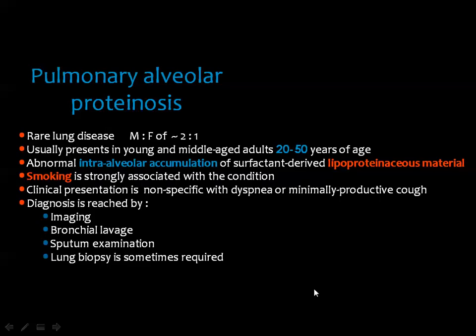Then we come to pulmonary alveolar proteinosis. You remember, we are discussing now the patchy alveolar opacities. We have finished with pulmonary alveolar edema, Bat's wing configuration, the pneumonic consolidation, pulmonary hemorrhage, and bronchoalveolar carcinoma, and we'll finish by this, which is pulmonary alveolar proteinosis.